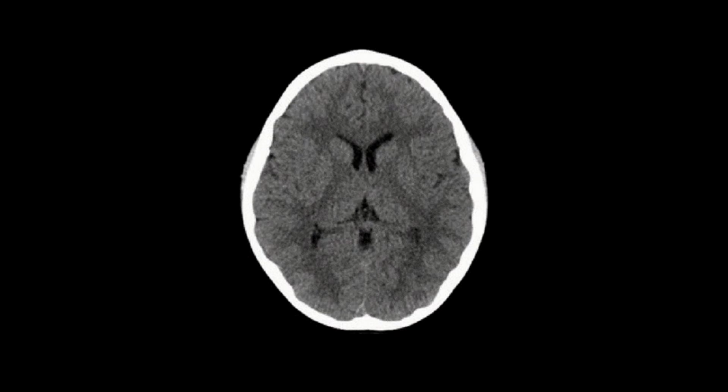All these axons from all over the body are highly condensed in the region of the internal capsule. Let's look at that first. We already saw the caudate nucleus, the lentiform nucleus, and the thalamus. The internal capsule kind of zigzags between these three structures. So it's right here on either side. This huge bunch is the internal capsule.